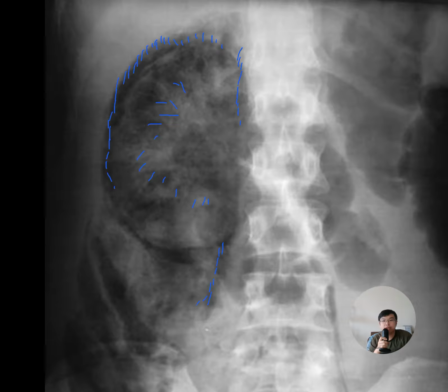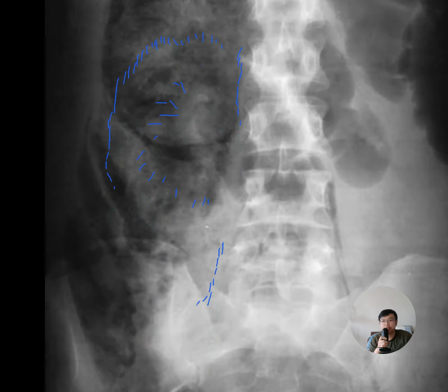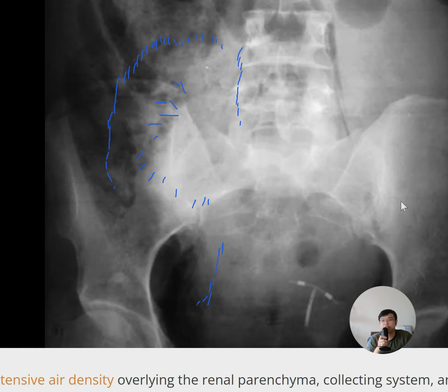Another thing that you may be required to know in examination is that usually this kind of patient has some predisposing factor like uncontrolled diabetes mellitus. So that's why you may also try to find any clues to support that. For example, any very extensive vascular calcifications in the arteries like the aorta, renal arteries, all kinds of branches of the abdominal aorta, and also the iliac region.